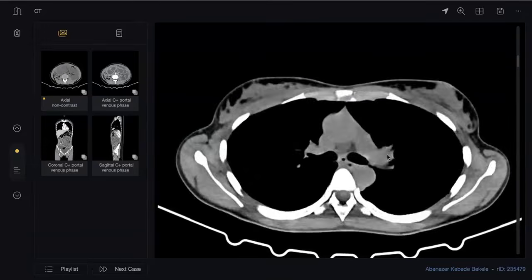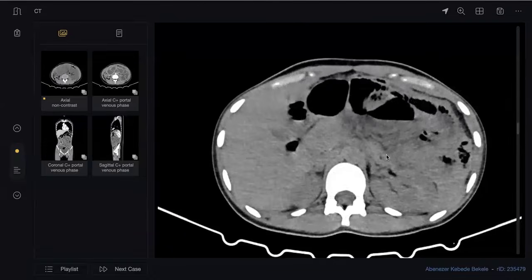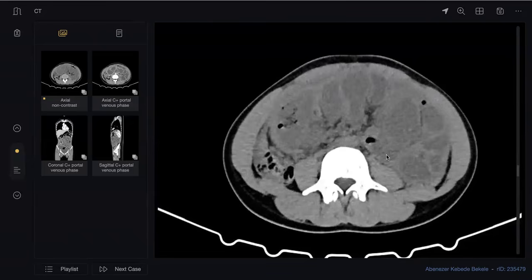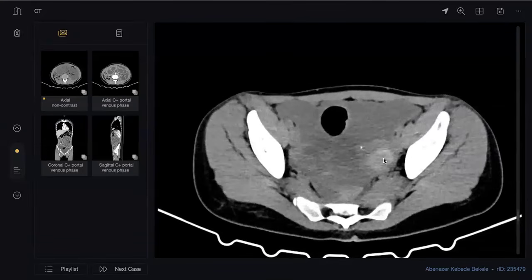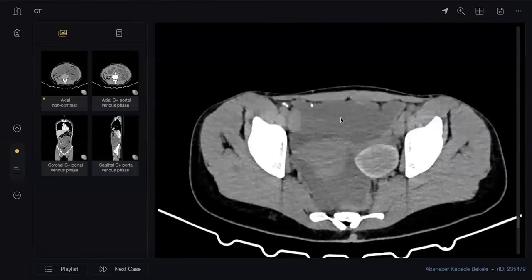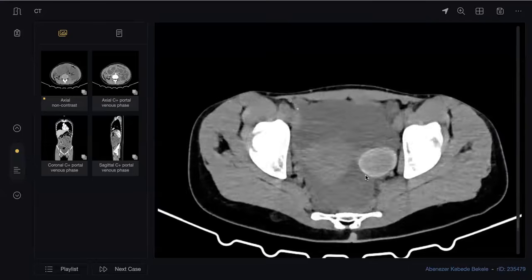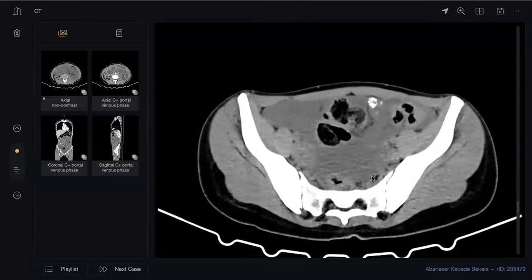This is a CT chest abdomen. And now I will go again to the point of interest. So in a young female patient, there is ascites and multiple calcified foci within the abdomen, diffusely scattered, and another high density structure also seen in the left adnexa.